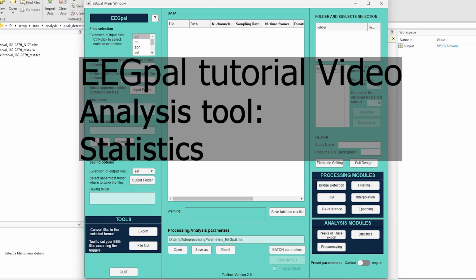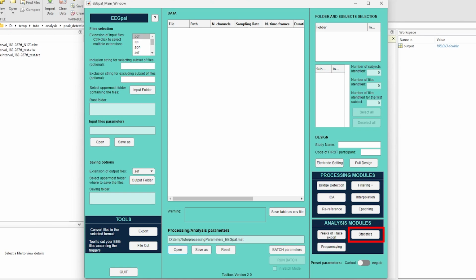Welcome in this tutorial video on EEGpal. We are going to see how the statistics model works, which permits to perform statistics on tracks.